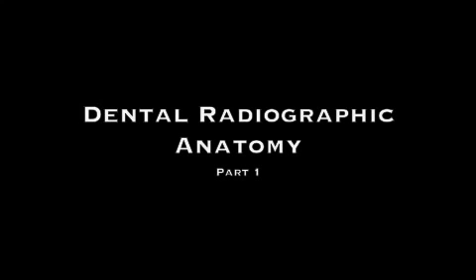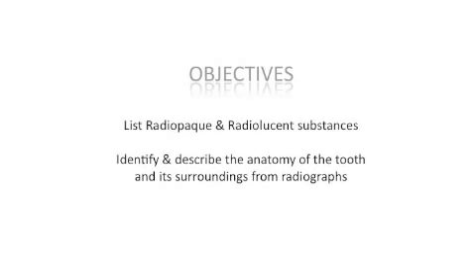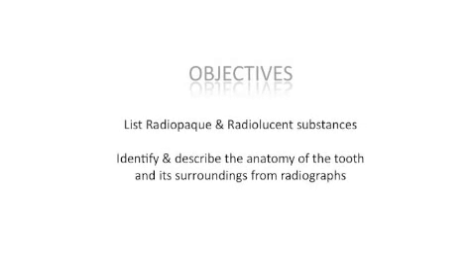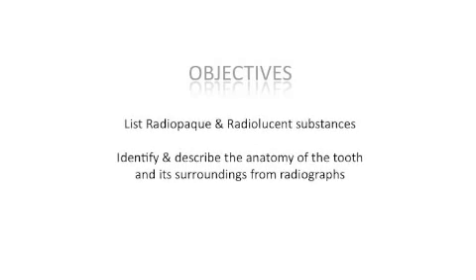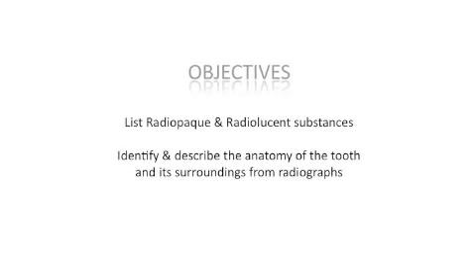These slides on dental radiographic anatomy are to help you study and review. List radiopaque and radiolucent substances. Identify and describe the anatomy of the tooth and its surroundings from radiographs.